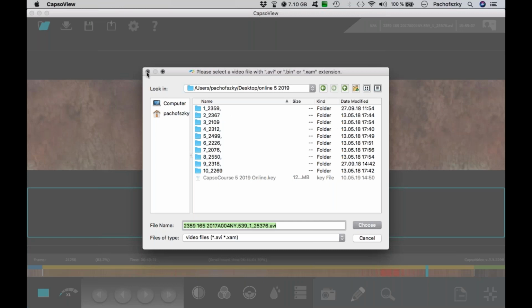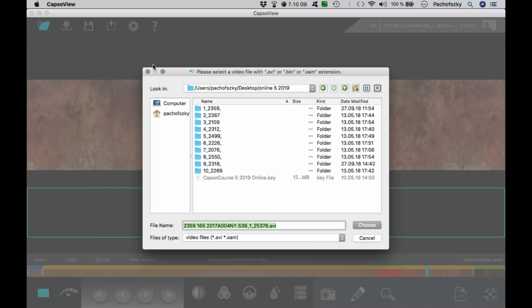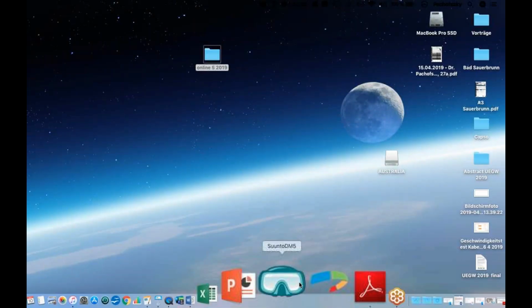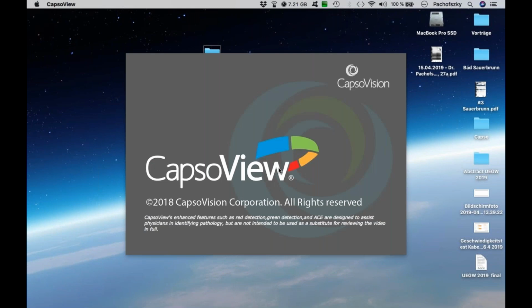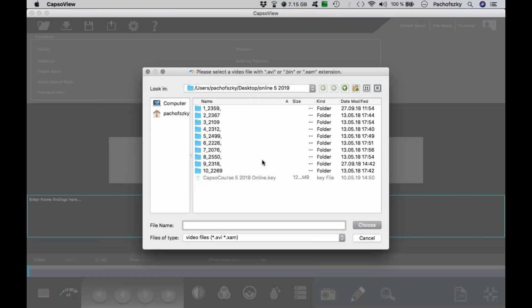So you can start a video here in this area with opening video, or I will close it. If you get on totally new with the software, you can start it. Then you can also get here to go on with the first video.